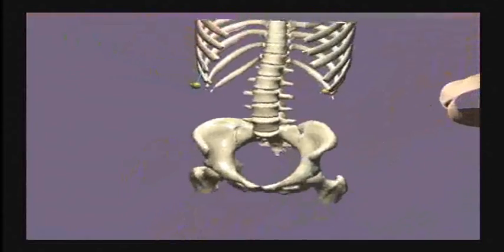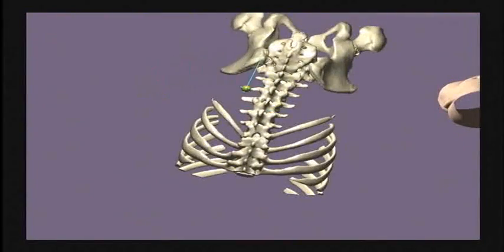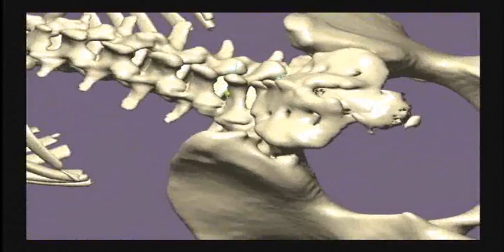Here we're just looking at the clearances between vertebrae to demonstrate navigation with the Two-Handed Interface. Now we grab the skeleton and flip it over and shrink our viewpoint to enter the spinal column.